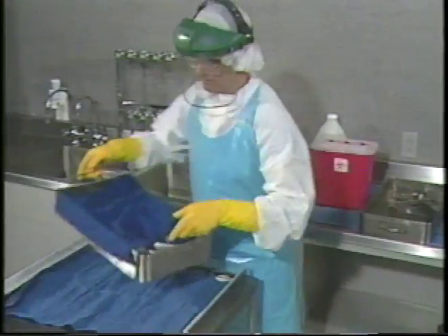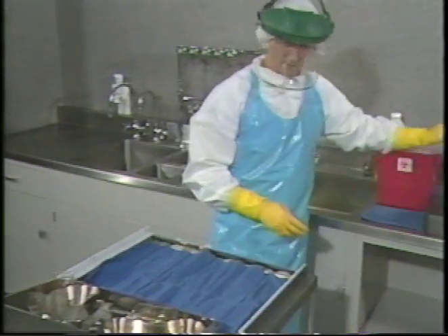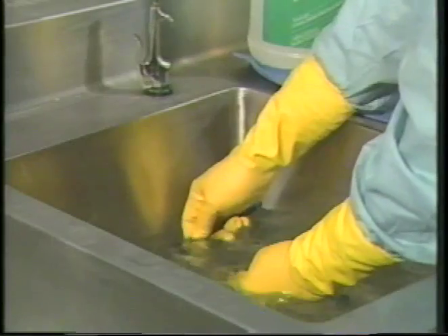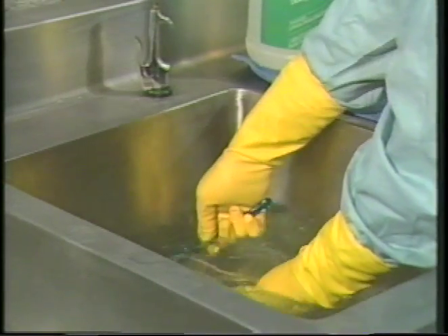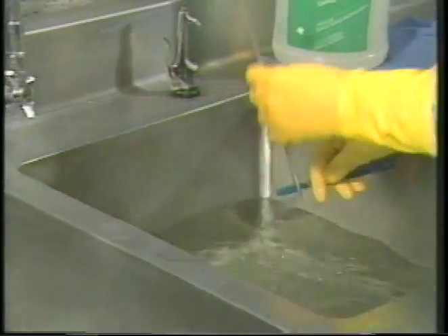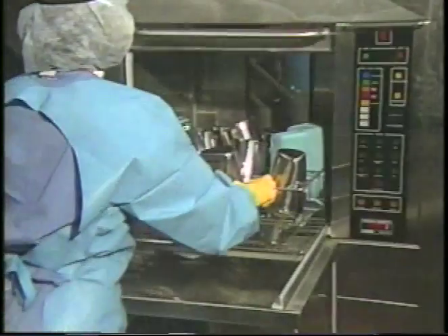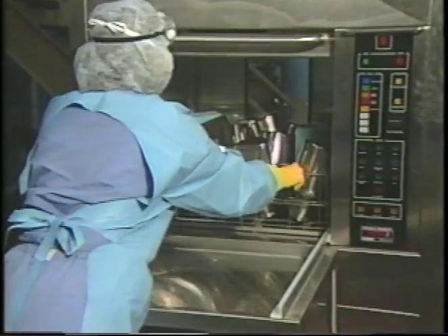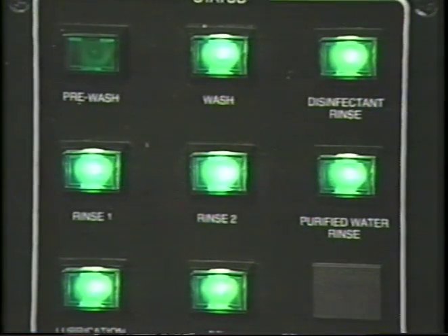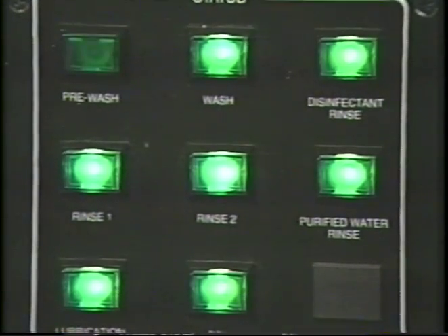Pre-sorting of the load, keeping in mind the principles of washing, can not only expedite the washing process, but also improve its efficiency. Pre-washing of grossly soiled devices with water can remove a high percentage of soil from the device. This action is obviously enhanced by the factor of mechanical action and coverage when correctly applied either manually or when used in the selected mechanical washer. The purpose of pre-washing is to prepare the load for proper washing and to saturate the soil for efficient cleaning.